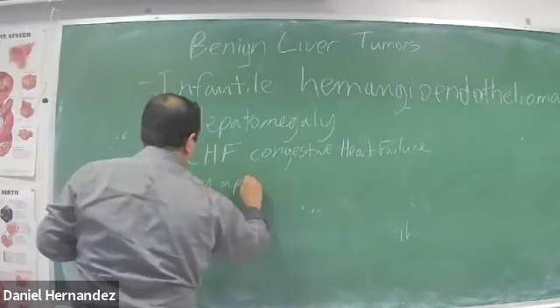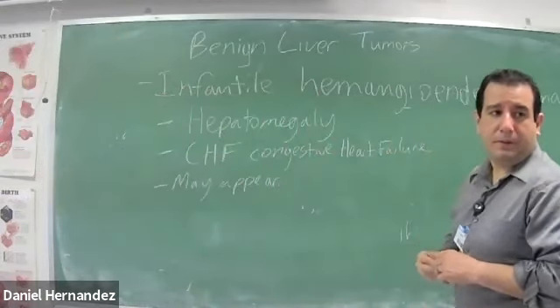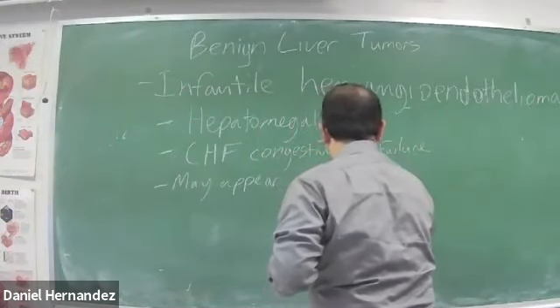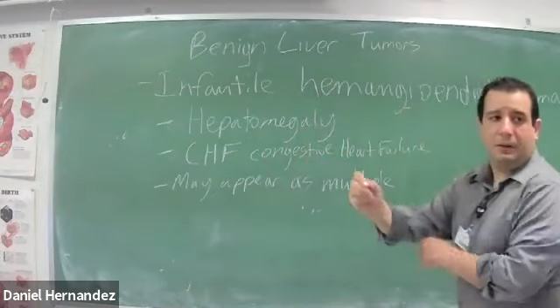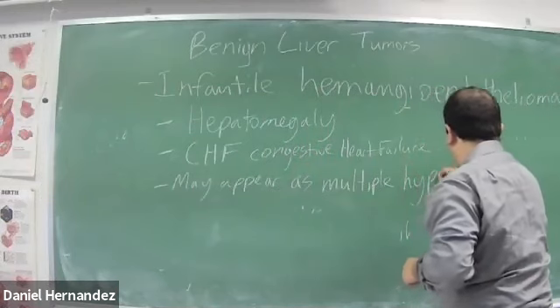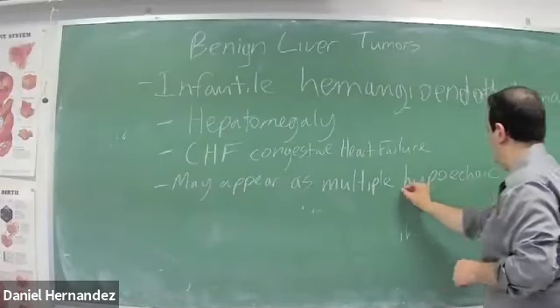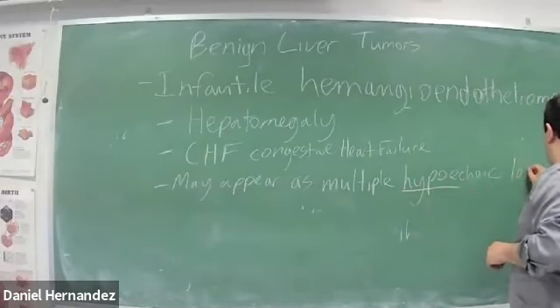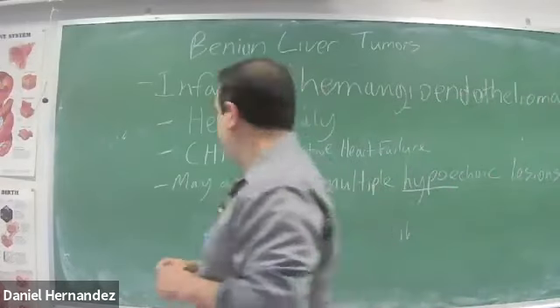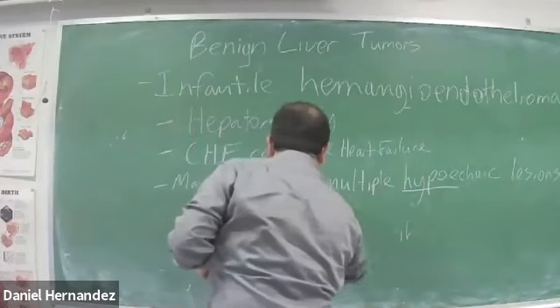They may appear as multiple hypoechoic lesions, or a solitary mass.